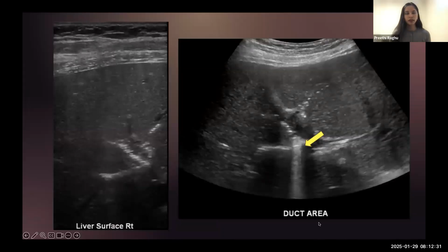And then other things that can cause dilation of the ducts are things like gas. So this is a zoomed in ultrasound image where in the expected region of the intrahepatic ducts, we're seeing a lot of these hyperechoic or bright little foci. And it looks branching, like it's going exactly where we expect the ducts to be. And we could see that also in the common bile duct. And in fact, closer to the region of the common bile duct, some of these echogenic foci also have this bright region deep to them, which is what we call dirty shadowing.